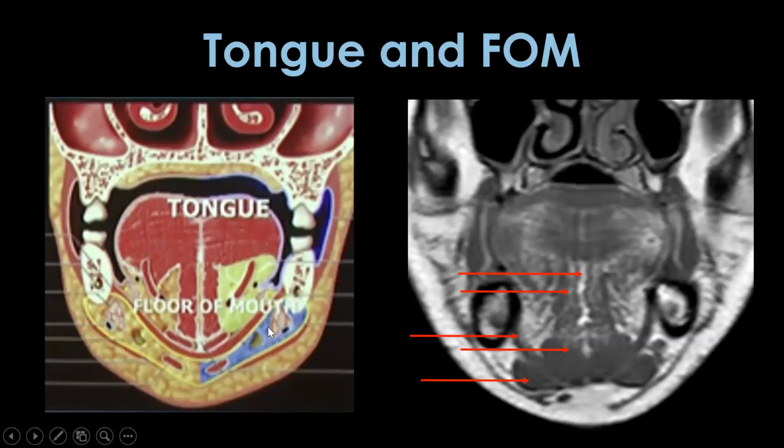So next is coronal sections. In coronal sections, we can delineate the floor of the mouth. Roughly, this is the mylohyoid sling. Either everything within this cup forms the floor of the mouth, or we can draw a line along the superior cortices of the mandible. Anything below it forms the floor of the mouth. What muscles can we see here? The central fatty lingual septum, the paired vertical genioglossus, the geniohyoid, and below these muscles the anterior belly of the digastric. This is the cup, a representation to show that everything under this is the floor of the mouth.